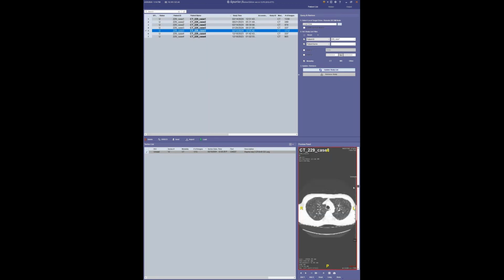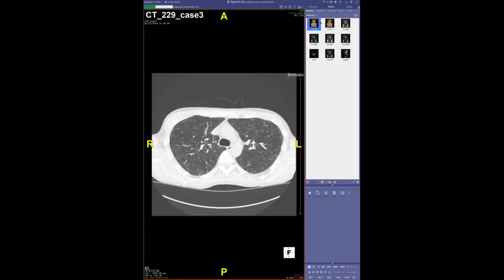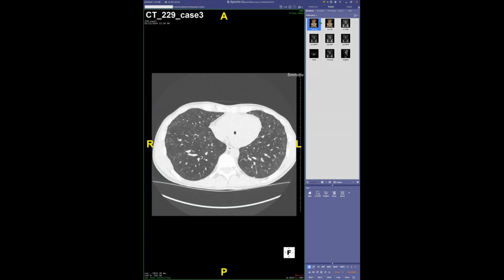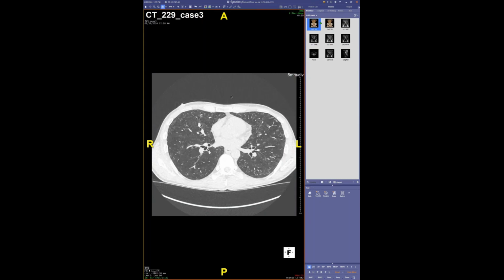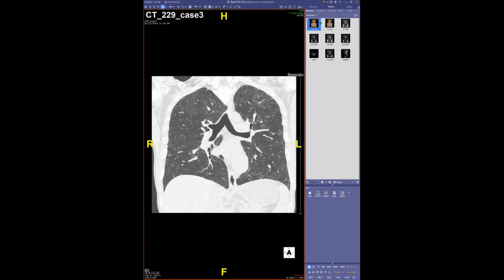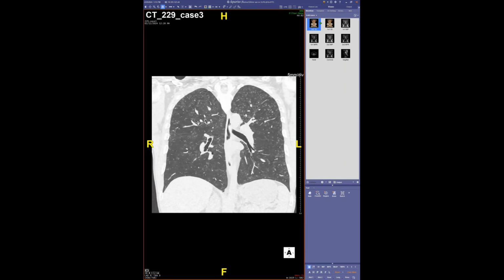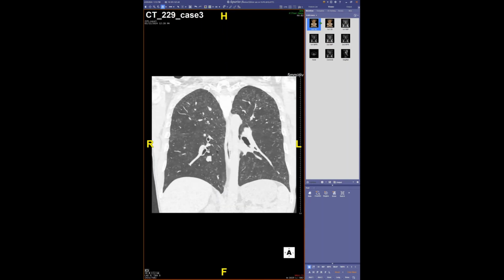This is an interesting case because, let's see, which one is which? Oh, this is a cool case. So this is a patient I saw a couple of weeks ago and I saw this and I'm like, diffuse centrilobular nodules, upper lobe predominant, no mosaicism. The kid's like 22, and there's a differential. Of course, you think something inhalational. It is upper lobe predominant, and the first thing that popped in my mind whenever I see a young kid is, could this be EVALI?